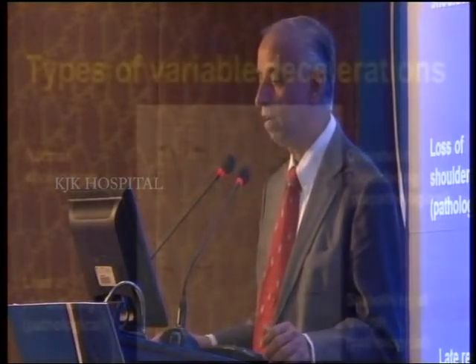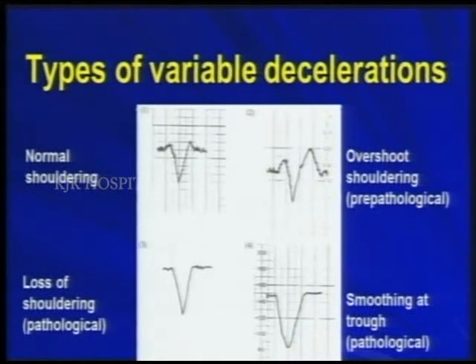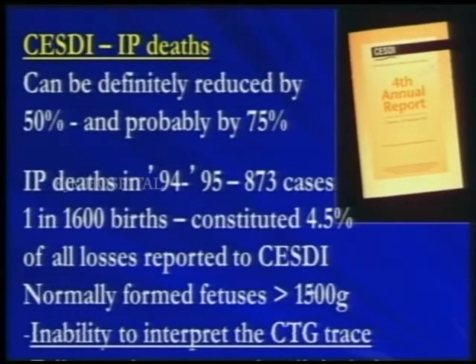But if any abnormal features happen outside these two lines, at the beginning and the end, they are called atypical variables. Say, for example, in the same baby, there might be IUGR, that means the placenta might be small, and oligohydramnios. So the oligohydramnios will cause variable decelerations, and the reduced placental size will cause the late deceleration, bringing about a combined biphasic deceleration. And if you merge it together, it will be late recovery. And similarly, if the depth and the duration is over 60, it's not a good thing, and we will recognize a pathological or abnormal CTG.